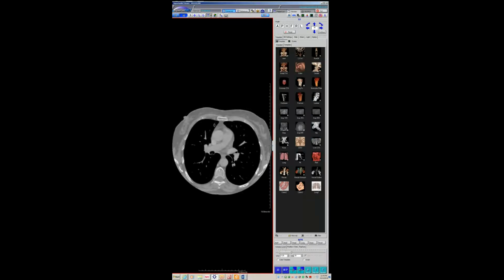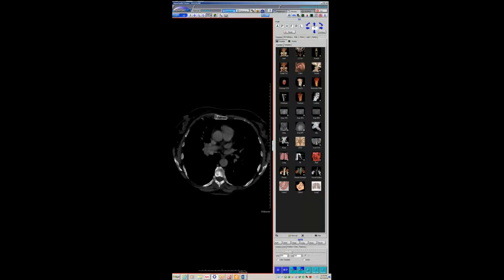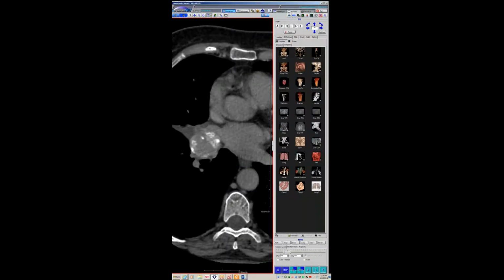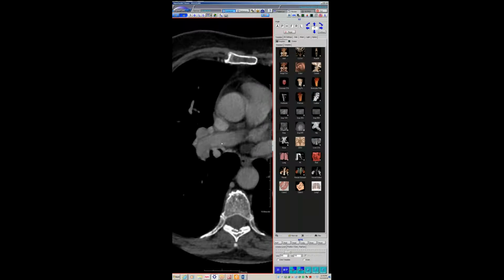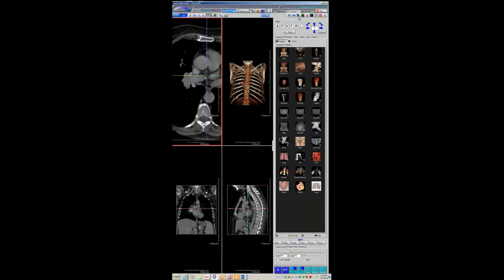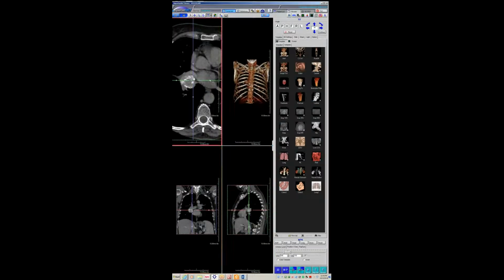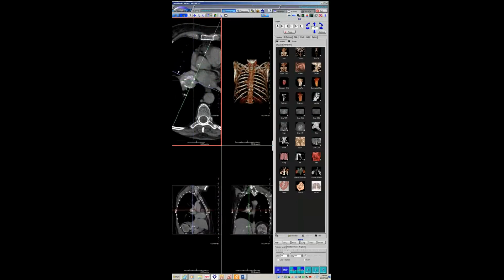But if you look at the portion that extends into the bronchus, like here, there's an endobronchial component, and it's quite bright. So yes, it is extensively calcified, and that is another thing for carcinoid, but also the degree of enhancement of the lesion. And I do have non-contrast to show both the enhancement and the degree of calcification. Cool. All right.